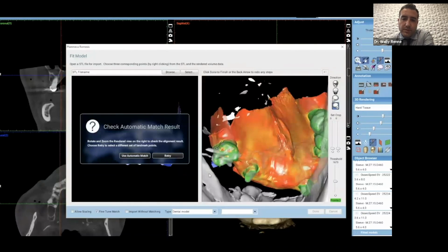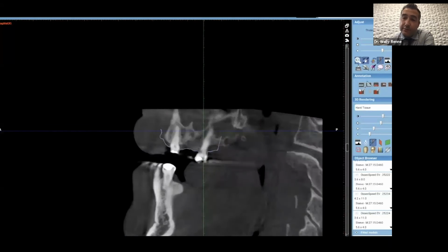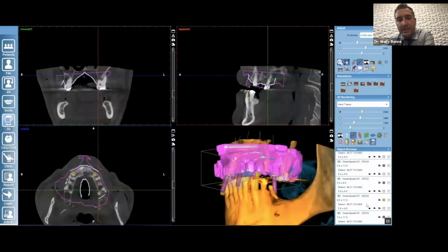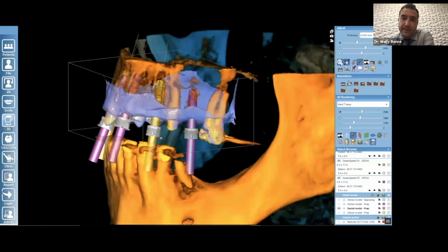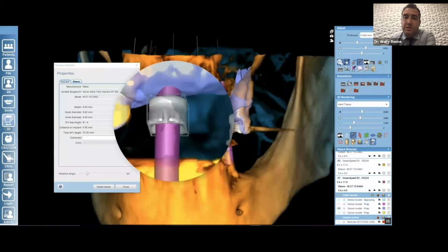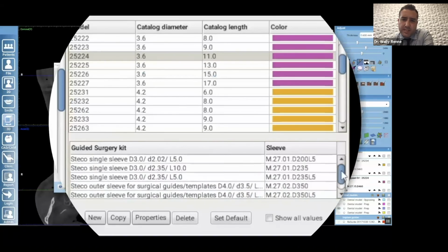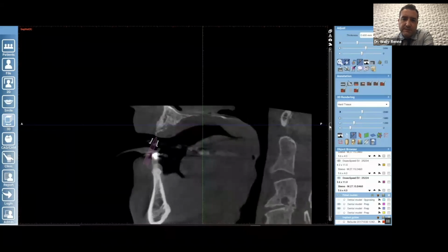So the first thing that we merge is the intraoral scan, okay? And then we make sure that we have a really close match of those two separate and distinct 3D files. And then we go ahead and we bring in our wax-up. Our wax-up was done based off of the facially driven smile design in Romexis. And so now we're going to use those positions to determine the locations of the teeth and therefore the locations of the implant in the bone. And in this case, we're planning some Astra OsseoSpeed EVs, and we're going to go ahead and set our sleeve heights.